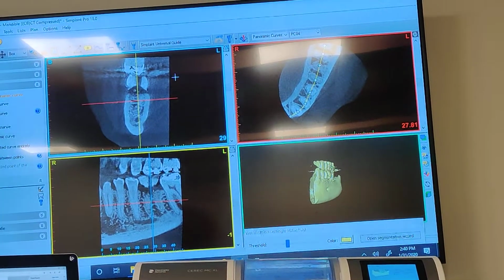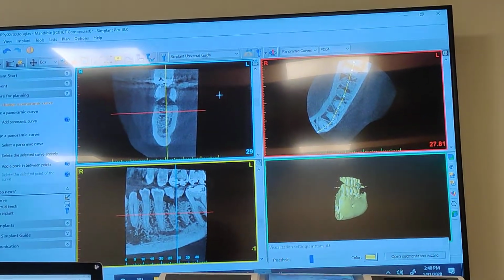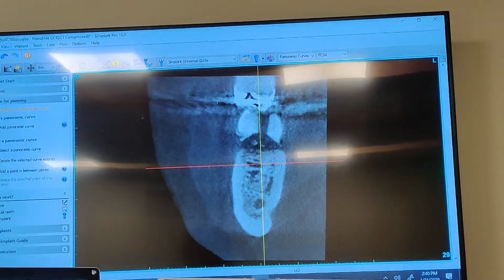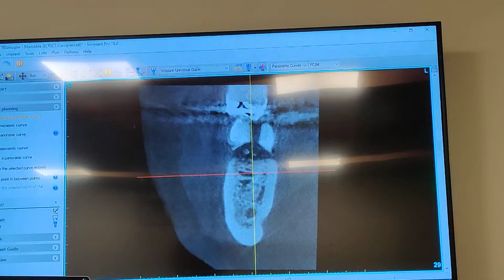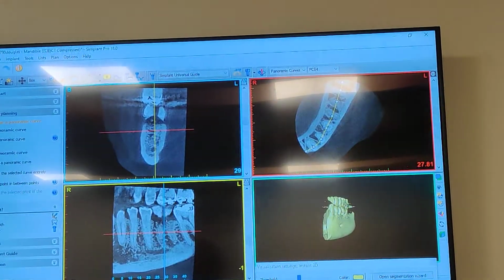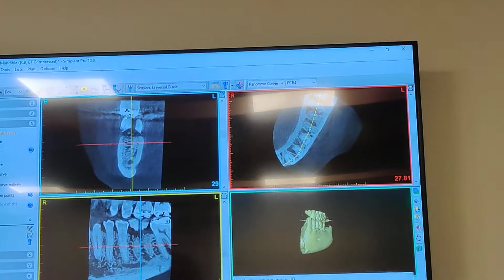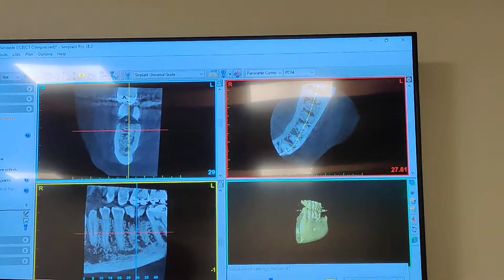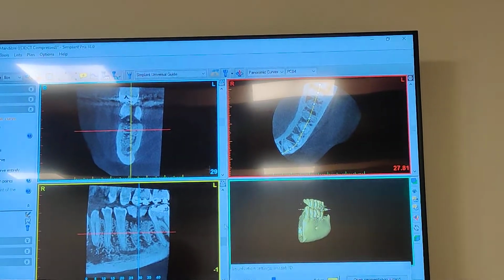Now, I don't like working on that small. So I come to the window I want bigger. Okay, I'm in the aqua window. See my pointer? And I hit the space bar. I hit the space bar and it makes the window bigger or smaller. Your cursor has to be there to do that. My cursor has to be in the window. If it's down here, it's going to make this bigger. If it's over here, it's going to make this bigger. If it's down here, it's going to make this bigger. Isn't that super cool? I mean, it's just amazing.